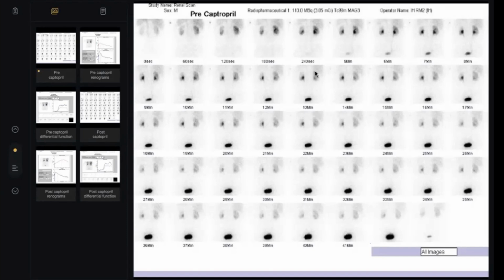Doctor, this patient, we are in a big doubt about renal artery stenosis because he is hypertensive. Look with me. Is this right or left? This one is posterior imaging. Excellent. So this one is left. More than excellent. My colleague, this is one of the most important points. In renal scan, the patient is in prone position, so the left is your left. So this is the left kidney.